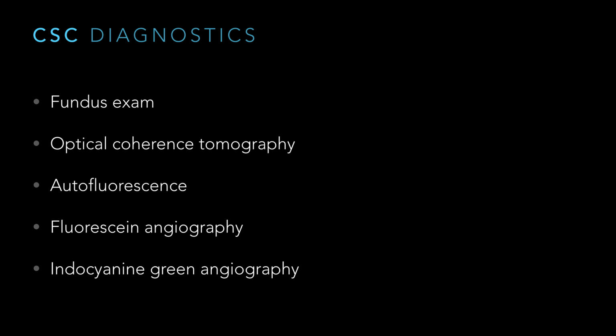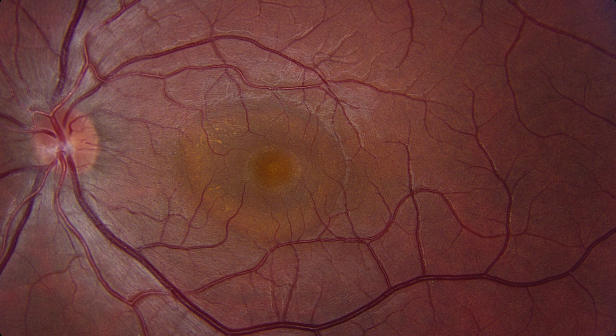So when doing a workup for central serous, imaging is critical. It's great when you don't have to do any lab tests or x-rays. You can just figure it all out in your own office. So I'm going to go through some color fundus photos first.